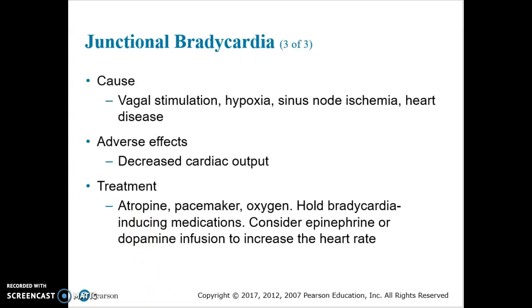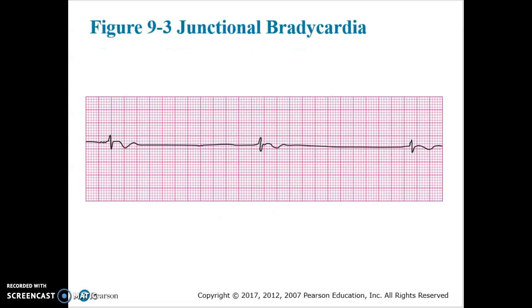So looking over here, let's go through this. What is the first thing we're going to ask ourselves? Do we have QRS complexes? We do. Are they shaped the same? This is not our typical QRS complex, but we do have them, and they are shaped the same, and the rhythm is regular. And if you count the little blocks between the R and the R, we'll have a heart rate of 23. That's very slow. The P waves are absent, or they're not visible in this slide.